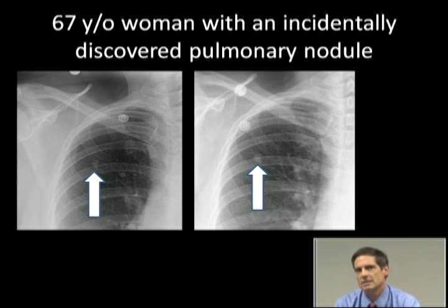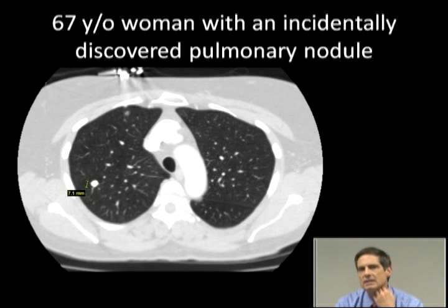And that nodule certainly seems to be getting more conspicuous through time. So we've got to worry that this is a growing metastatic deposit or some sort of lesion that's picking up steam through time. We did a CT on this patient, and this particular lesion was densely calcified throughout the entire lesion. It's marked there, and we measured it, and no matter what the window and level setting was, it was almost as dense as cortical bone.